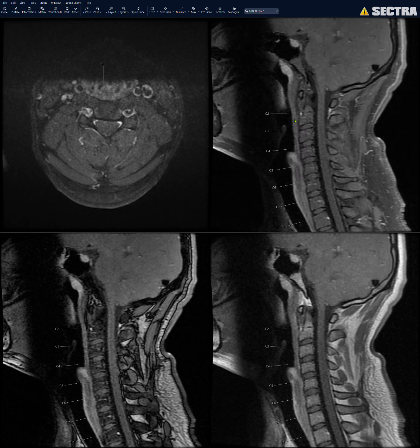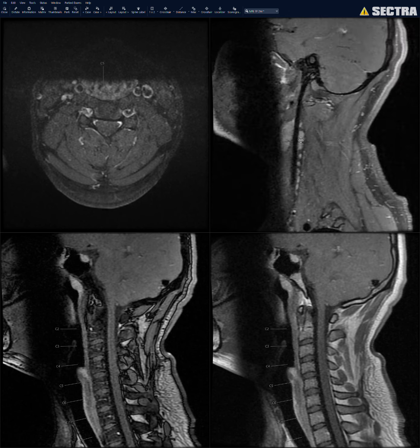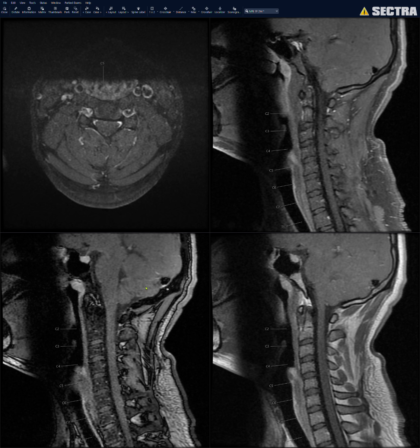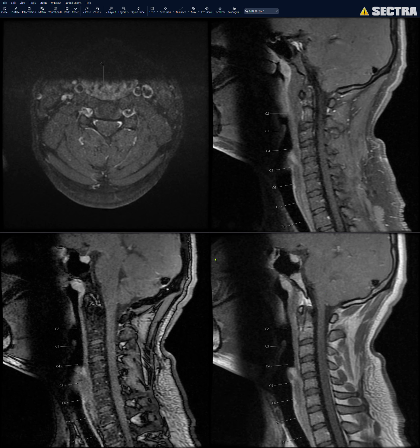Okay, and I look at prevertebral soft tissues, make sure I don't miss anything, any abnormal enhancement. Okay, and then for these sequences here, the out of phase and in phase, sometimes you can just ignore them because the point of these two sequences here is to make the sequence up here.